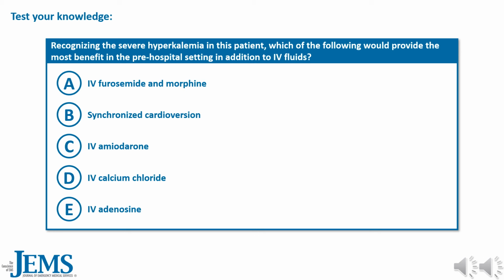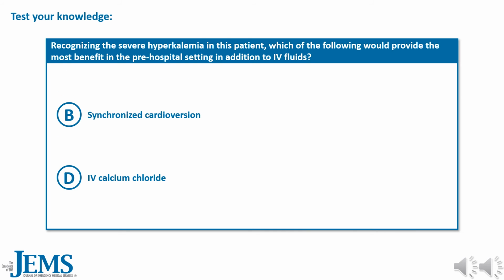It's not E, IV adenosine. It's not C, IV amiodarone. It's not A, IV furosemide and morphine. And it's not B, synchronized cardioversion. The correct answer is D, IV calcium chloride.